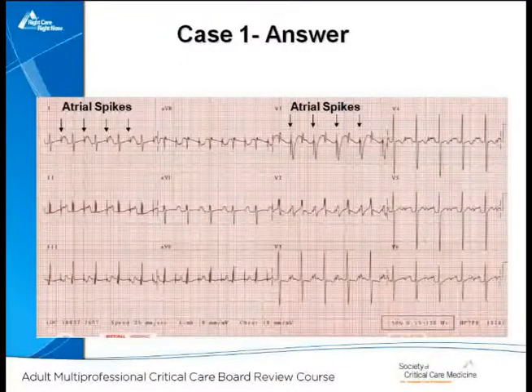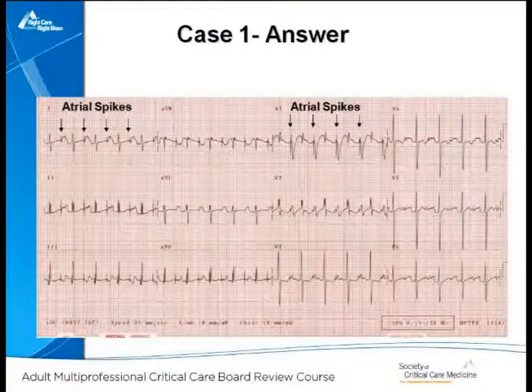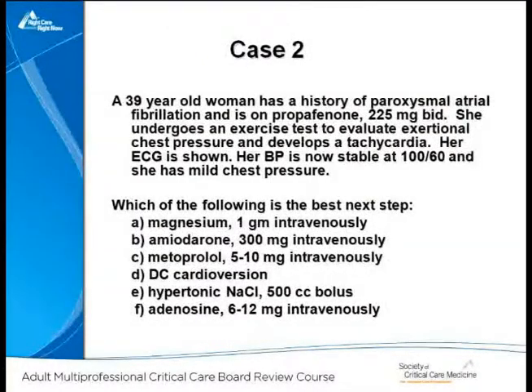But over here you have to identify that even though the signal is very large, that's still an atrial signal. And if you track it down with the simultaneous ECG recordings, it becomes easier to see that. So straight AAIR pacing. That fools almost every cardiology fellow for 10 years, and they never get that right.